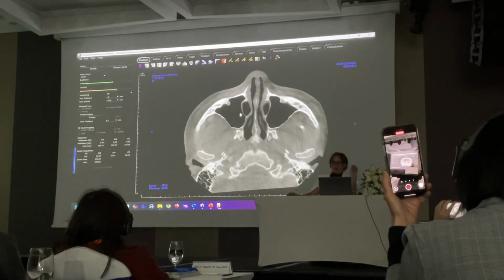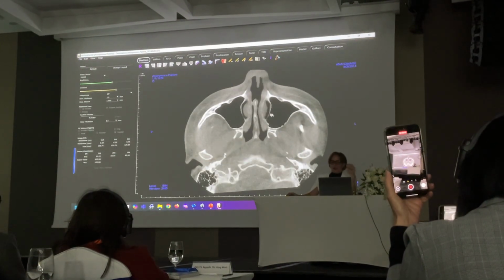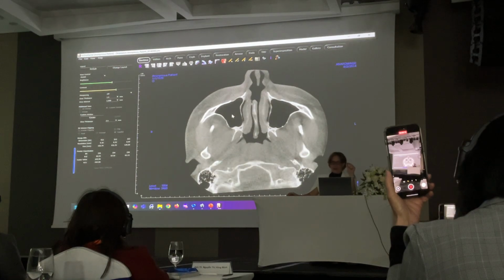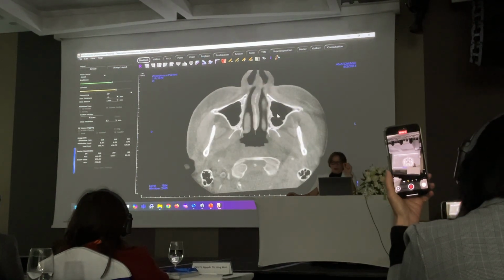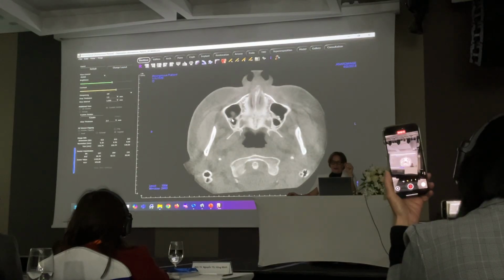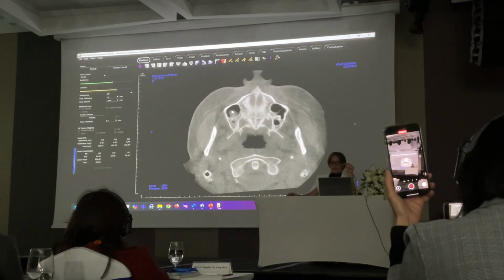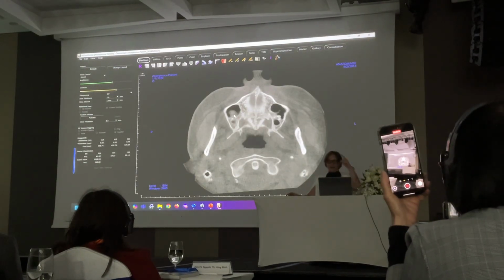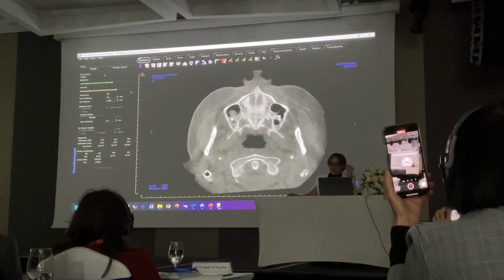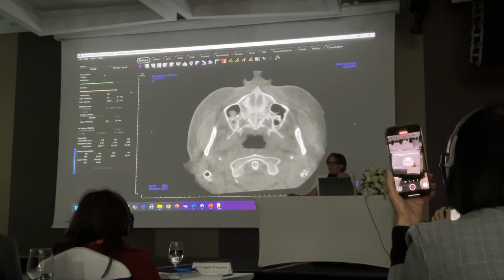So we're going to compare both sides. Go here and here, here and here, looking at both of these, looking for something gray. When the gray thing appears, say it. Yep, here, you see this? Come on, everybody. Everybody. There. You see? Right here. This is abnormality, okay? Something gray in the sinuses.